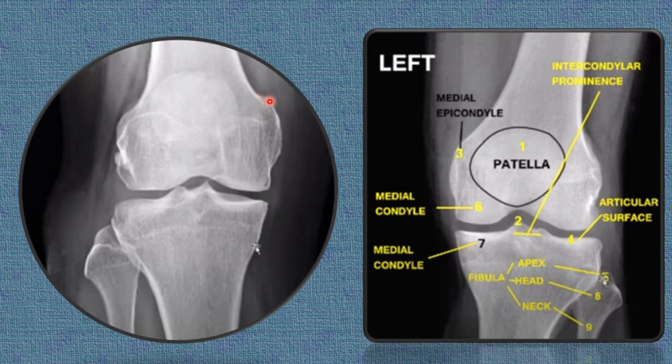And what is this prominence? This prominence is which tubercle? Adductor tubercle. This is the adductor tubercle, where the adductor magnus muscle attaches. And which part of the adductor magnus? The hamstring part, right? I hope you remember that. We have recently done it.